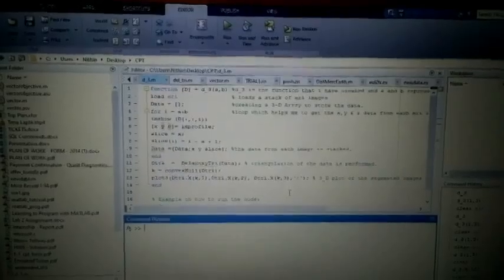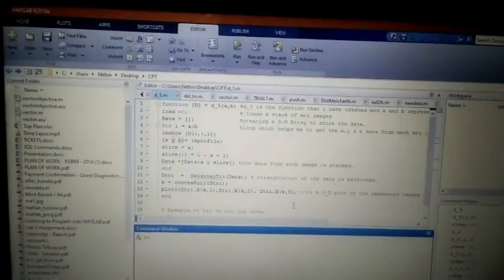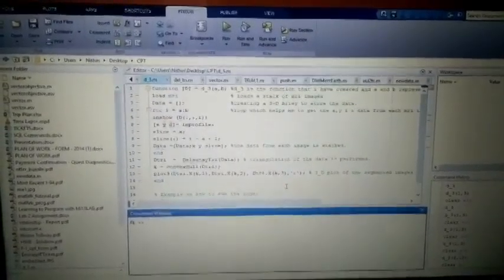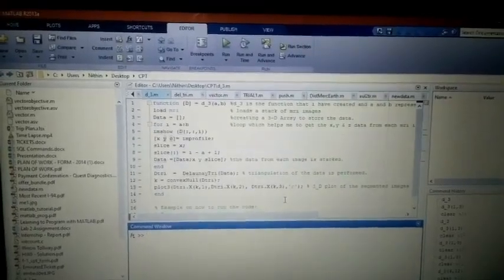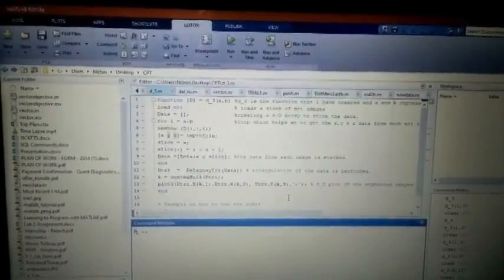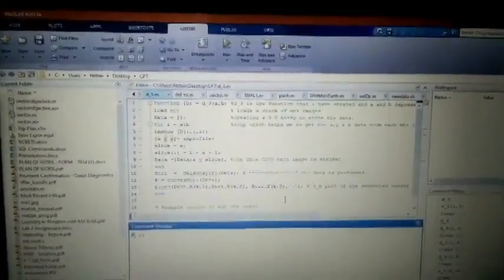and it is named d underscore 3. The d underscore 3 program takes two values, a and b, that is the lower limit and the upper limit of the images on which I need to perform the IM profile and get the 3D model out of it.